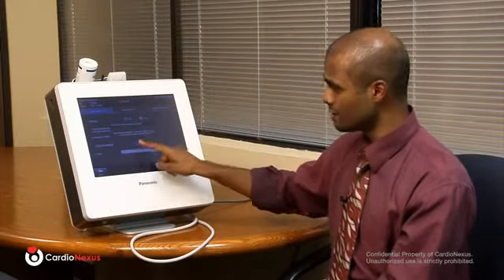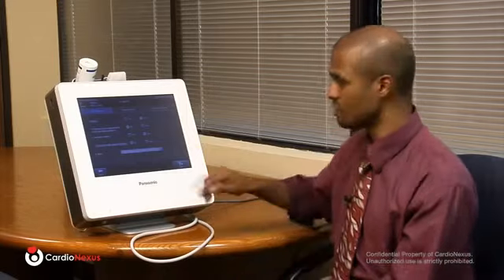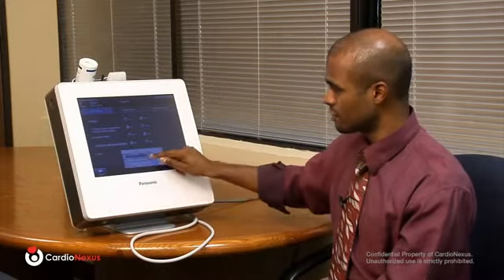Now, if for any of these questions the patient is unsure about what the question means, you can simply choose the underlined text for an NIH guideline essentially for that question. So this can be read aloud to the patient. In most cases they will understand that. And then since we do trend the IMT value against population data, we do require the patient's race as well. So I would choose that here.